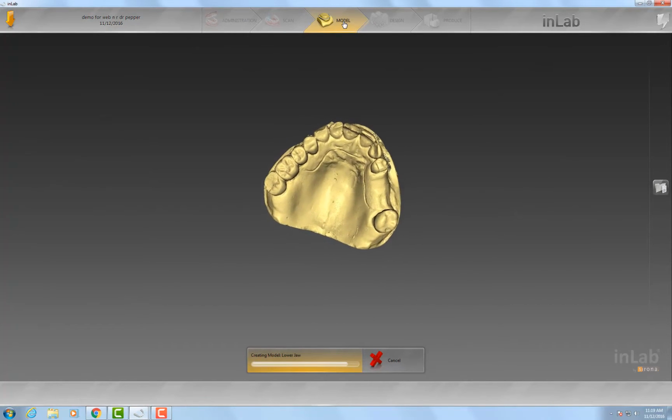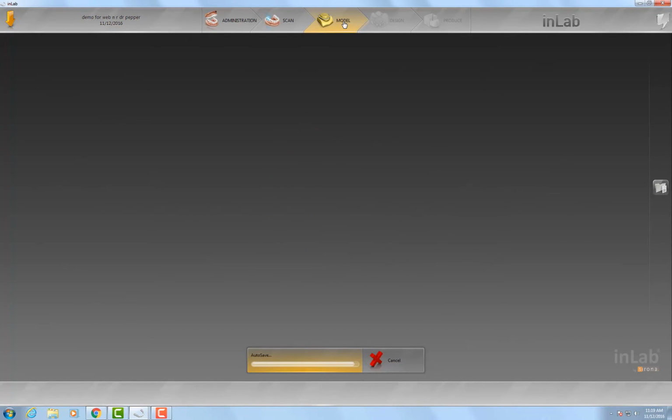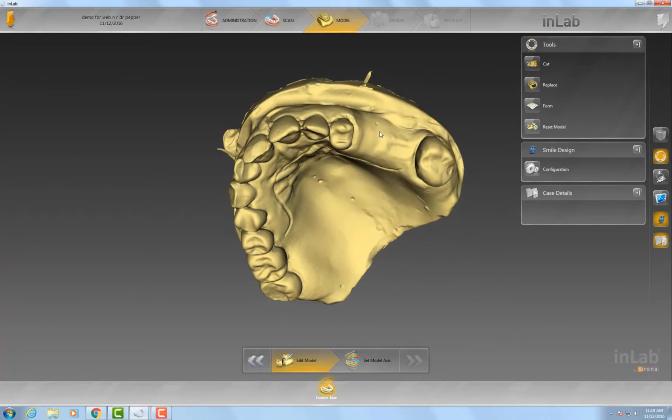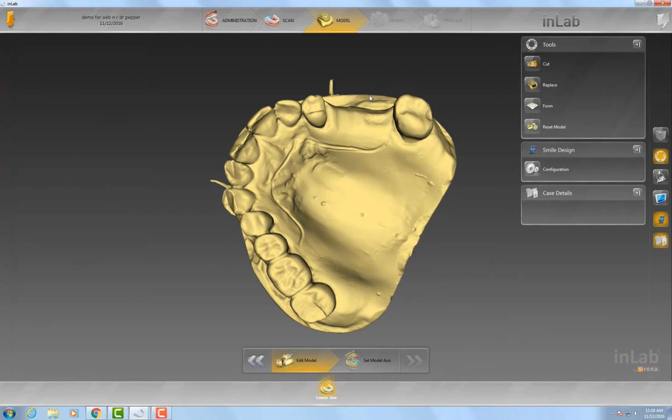It specifically saves you in blockout and duplicating models, as you'll see in future cases. You can actually print these models and be okay. Nobilium makes a great air barrier for this case. Once you get your model, I double inspect it to make sure all my features came out properly, which they do. I'm comparing them to the model right now, making sure my lines came out okay. Once they do, I go to this run application right here.